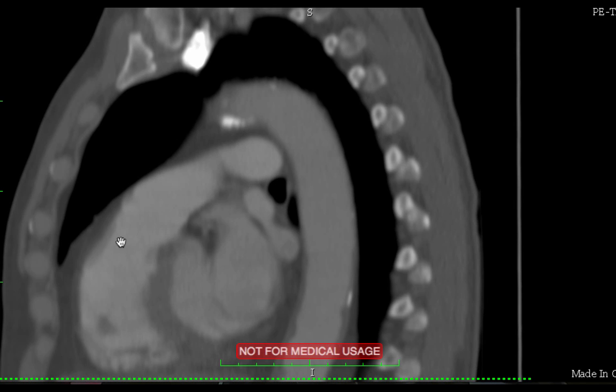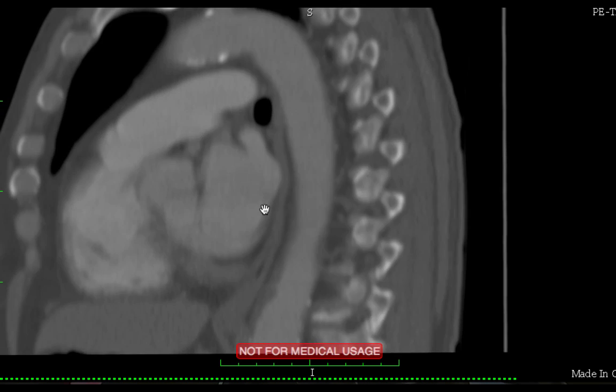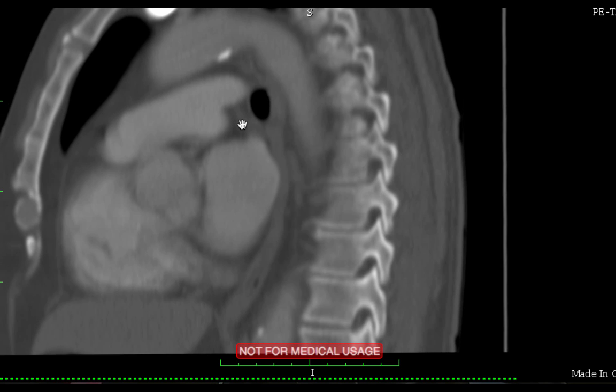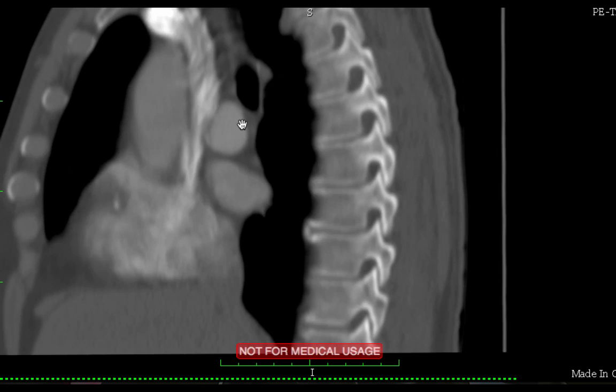And this is also, again, a nice depiction of the thick myocardium that borders the left ventricle, and the right ventricle is in front of it, and the left ventricle is behind it. And here you have even the left atrium and its two tributaries from the lung of venous oxygenated blood coming back from the lungs to go into the left side of the heart, initially the left atrium and then the left ventricle.